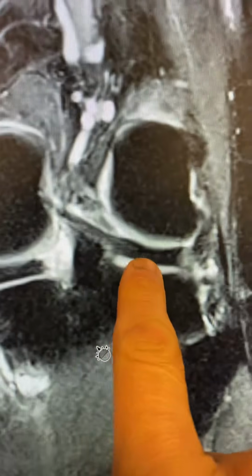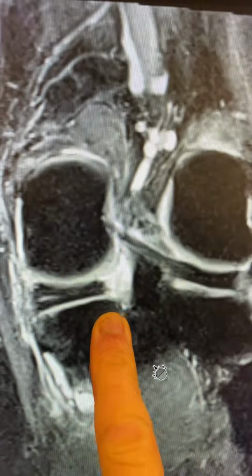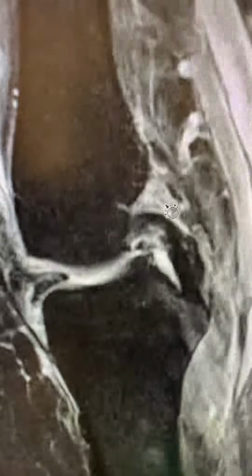You see this is a lateral meniscus, and there is no gap because it's normal. Medial meniscus, there's a gap right under my finger there. That's a gap. Go to the back, look for the gap. Don't forget that. Then when you go on the side view, or also known as the sagittal images, here they are, sagittal images.